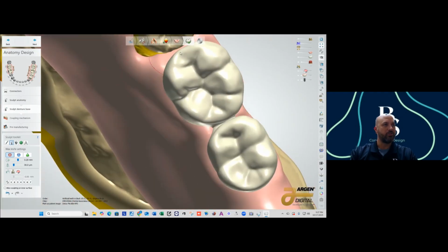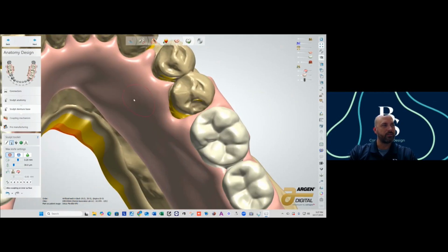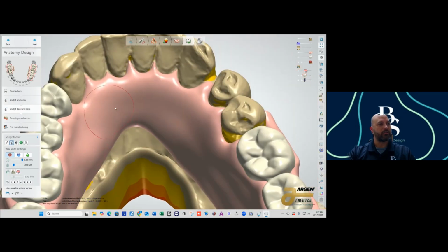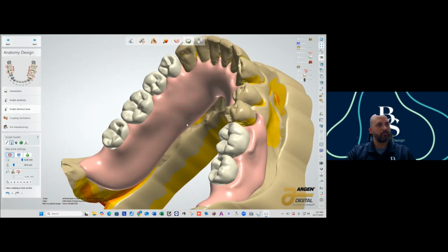The advantage to doing these digitally is that we are bridging the teeth together. So there's less likely a chance that any one tooth is going to pop out, especially if you do the bonding process properly, which we're going to go over after we print and post process.